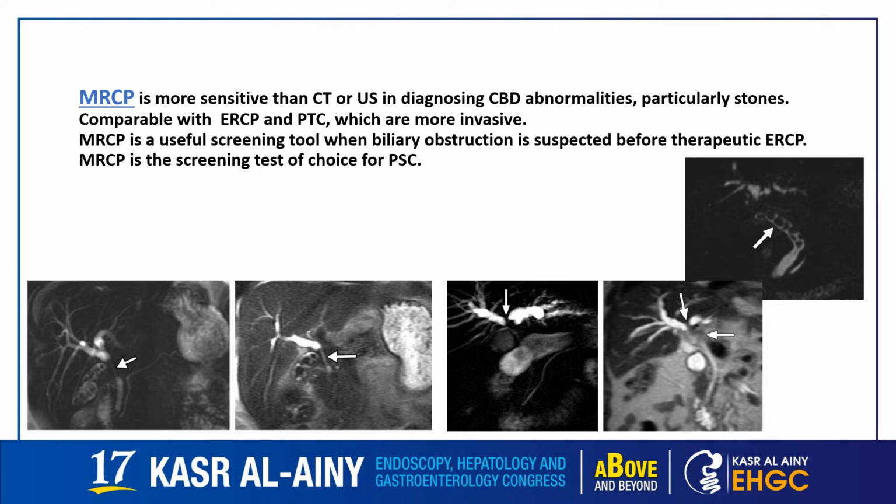MRCP images showing malignant biliary obstruction, hilar stricture caused by cholangiocarcinoma, and multiple low signal stones at the CBD.